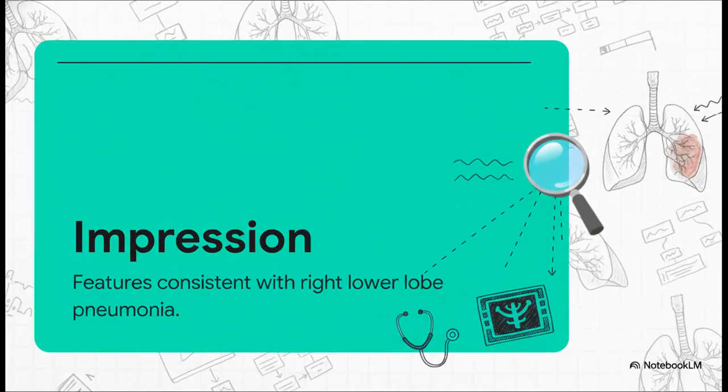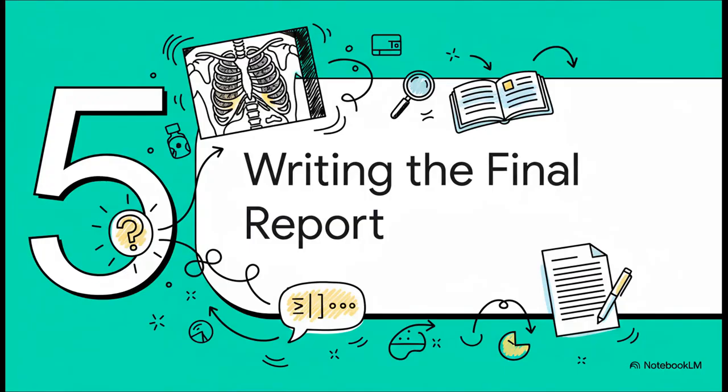So, just by following our steps, we can come to a really solid conclusion. That cloudy spot in the right lower lung, plus that blurred out angle, all the signs are pointing directly to a classic case of pneumonia. Now, finding the problem is half the battle. Communicating it clearly and professionally is the other half. So the final step is to take what we found and put it into a proper report.